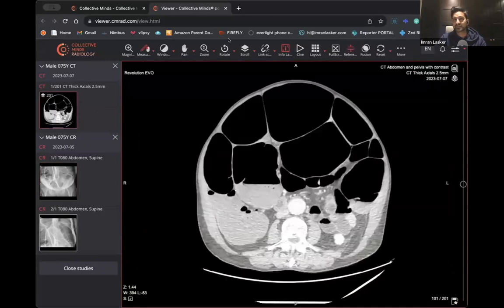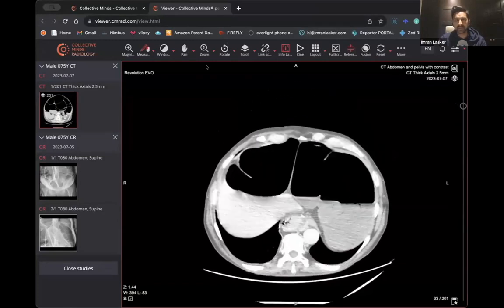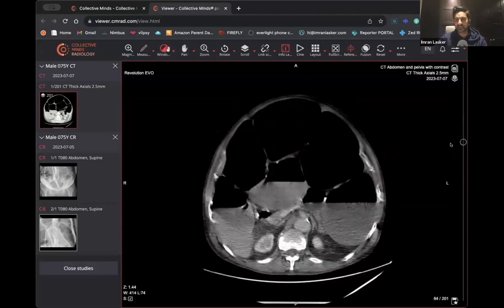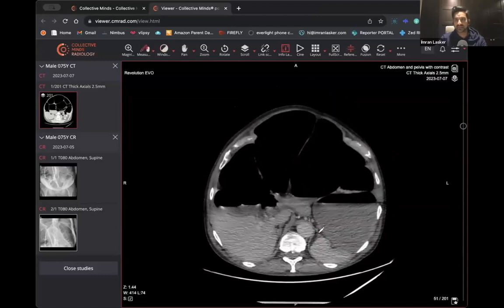Now, what we have is the CT scan, and we can have a look at what it looks like on a CT. This CT scan isn't the best of CT scans, I have to admit. Don't tell the radiographers. You've got to try and maybe window a little bit. And then that works a bit better, doesn't it? So we go from the top, and it looks like it's a contrast enhanced study. For those that can't tell, you look at the aorta and see whether it's slightly brighter.